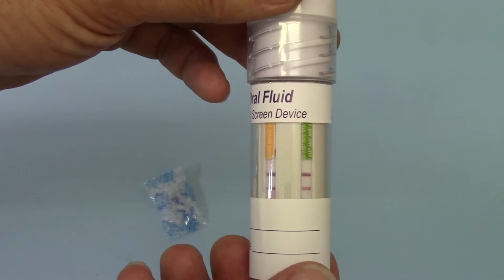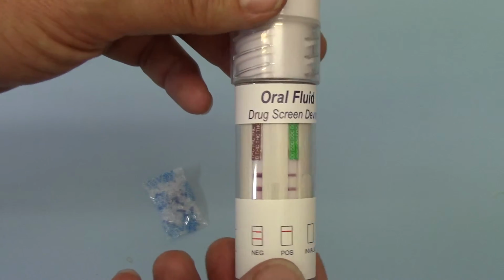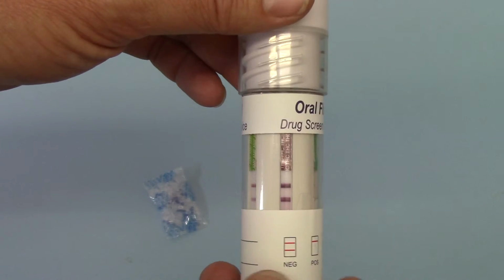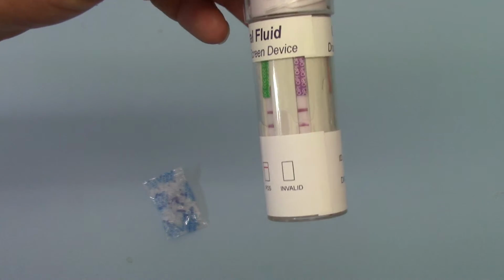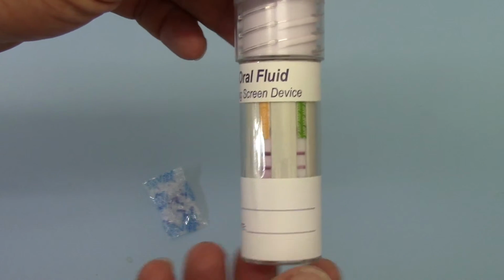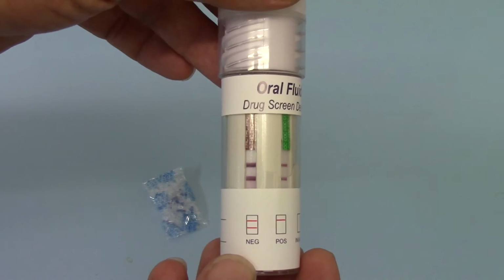If that occurs, it is possible for you to remove the test swab and ask the person to re-saturate it with further saliva, or to give you a saliva sample into a clean glass jar or container, food quality plastic container, and saturate further saliva into the swab and then apply it into the bottom of this test membrane. But without adequate saliva, you will not get all 6 tests showing. But this is a lovely clear result showing all negative.